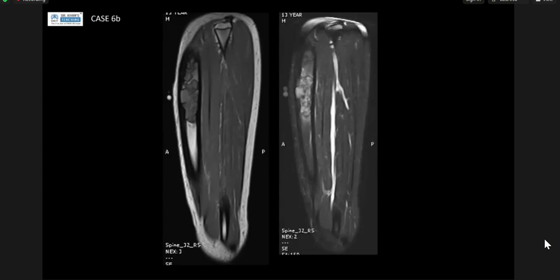With subtle edema on the medial, but I can see the lateral cortex to the fibula. I can see it well defined, but the medial cortex is encroached and destroyed. And so actually, do you mind if I stop you? Is that okay? Actually, the cortex is thickened. You have what looks like endosteal scalloping. Sorry. Yeah, no, T1, I can see the cortex well defined. It is basically growing into the cortex.